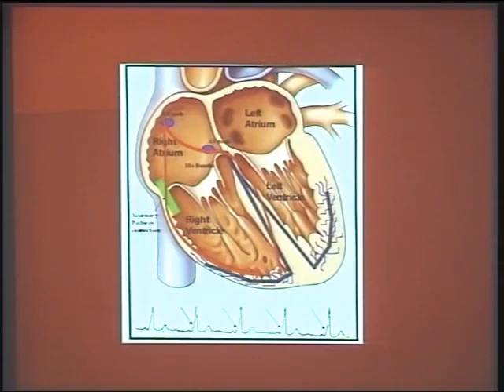So actually the WPW syndrome ECG complex is a fusion complex of depolarization fronts coming through the accessory pathway and through the normal pathway. The initial portion of the QRS complex is rapidly reaching the ventricle but then getting conducted slowly. That's why your PR interval is short and you will have an initial delta wave. By the time it is spreading slowly here, the normal impulse, after getting delayed at the AV node, gets rapidly conducted through the special conduction system that produces the terminal sharp portion of the QRS complex.